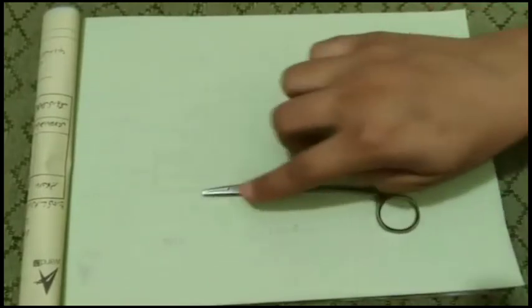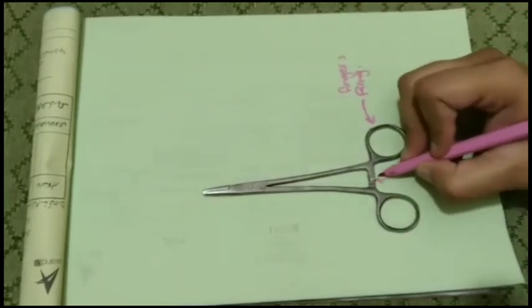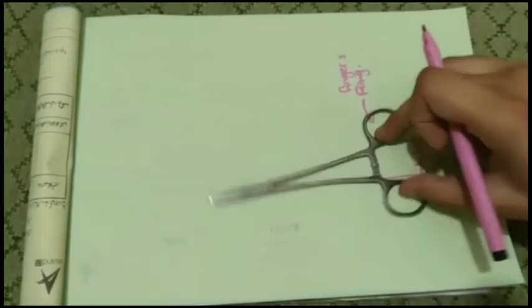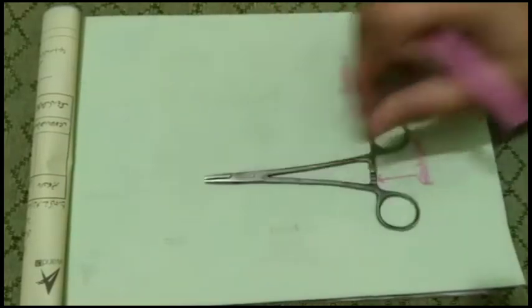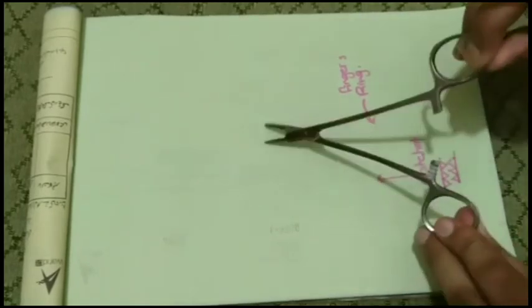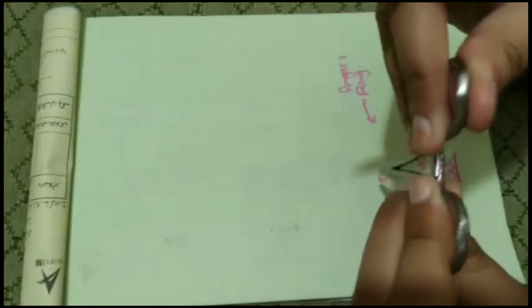This is a needle holder. These are the parts of the needle holder. First, this is the ring. This is known as the finger ring, thumb ring. Apply fingers to it. This is the ratchet joint. It is a separable joint. As you can see, there are many teeth along both layers of this joint. These teeth interlock with each other through the grooves which join with them. There are 3 levels of joining them, as you can see here: 1, 2, and 3.